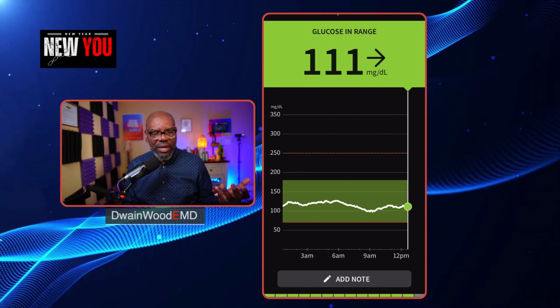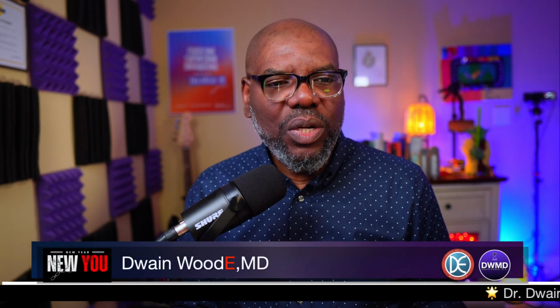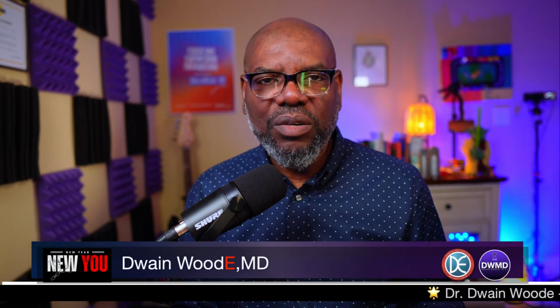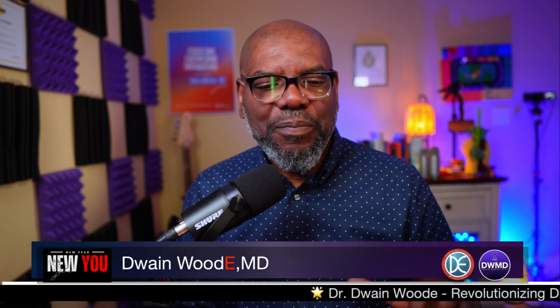So this is my monitor right now. I'm 111. That is what my blood sugar is, but I want to spend some time going through and talking about how continuous glucose monitors work in general, just a quick overview, and then I'll go into the app.